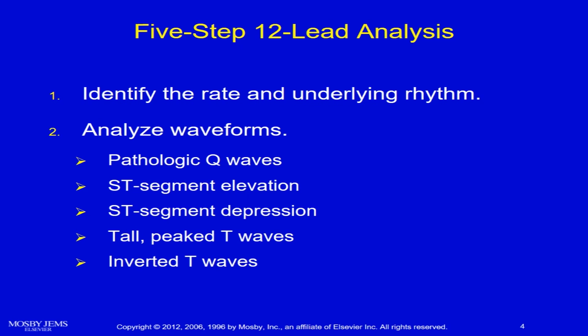That's right. Then we're looking, number one, for pathologic Q waves. What's pathologic? One little square wide, one little square deep. At least that much or more. Okay?